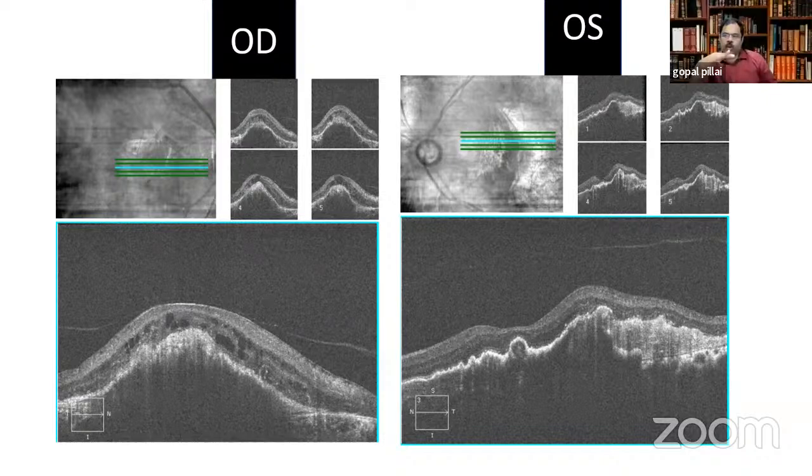It is a type 1 choroidal neovascular membrane with a large pigment epithelial detachment, which probably has stayed on for a long period of time. And that is why the scarring is there. That is why the intraretinal fluid is there. And that's why the RPE scarring is there.